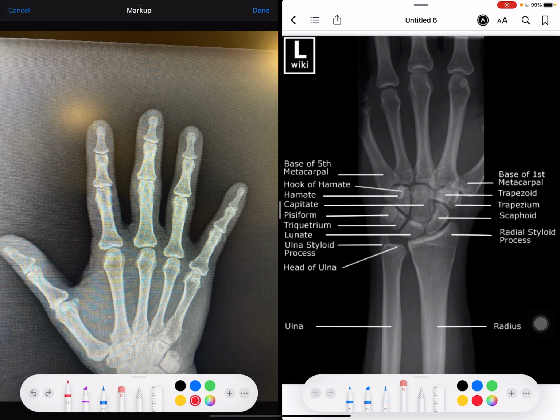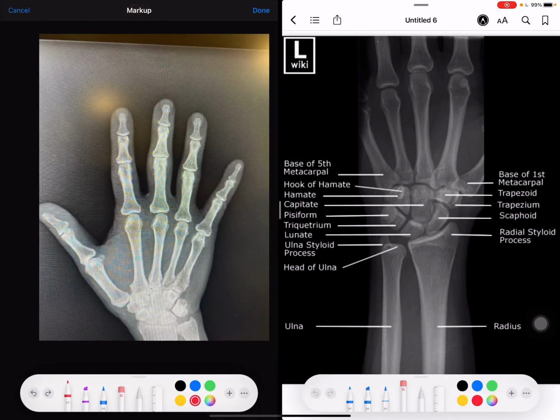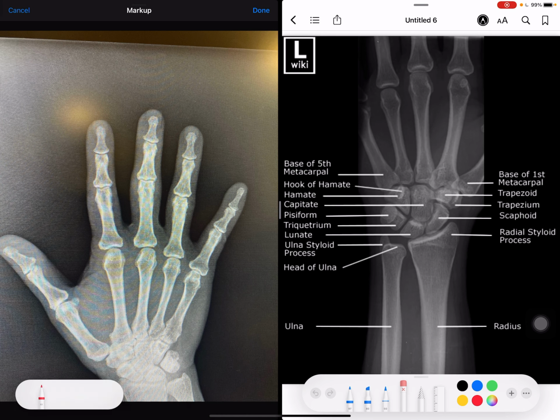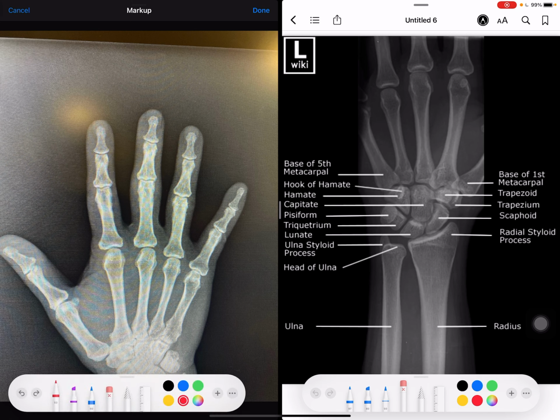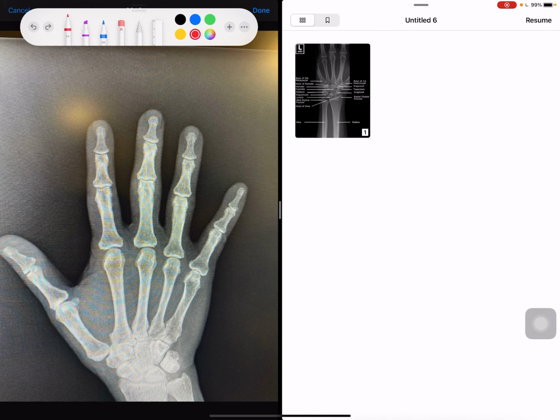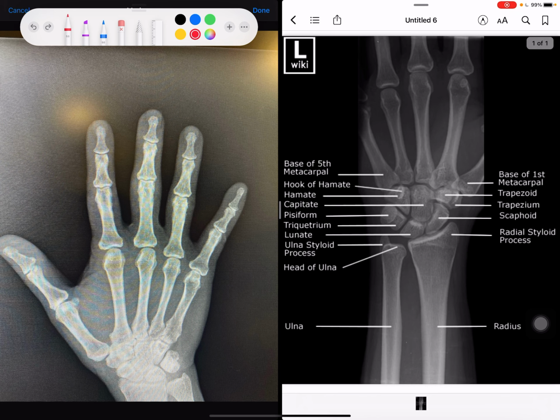No, I don't have another one. Can we pull this up? So we see, oh yeah, make it narrow. Oh, shoot, so we have to put this down here once you mark it up. Yeah, you can hide it. Oh, okay, good, so at least you can see. Anyway, this is flipped. Actually, you can do this though. Oh, yeah, way better. Good, I learned something there. Is there any way we can flip this around? I don't know. No. Okay. Anyway, we'll just pretend it's the same side.